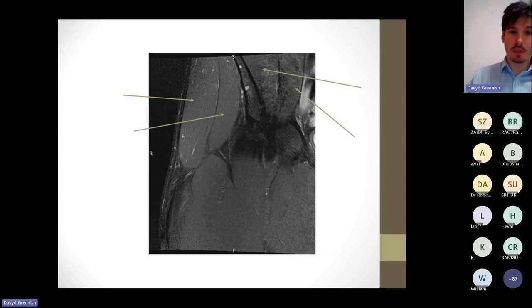But we've got big bone here, dark peripherally, so we know that's a bone. We've got lots of muscles around it. Quite characteristic appearance, that of the iliac crest here. So we've got a couple of muscles medial to that, a couple of muscles lateral. This blackness here is external to the body. So remember we talked about something sandwiching this iliac wing here. Does anyone remember which those two were?